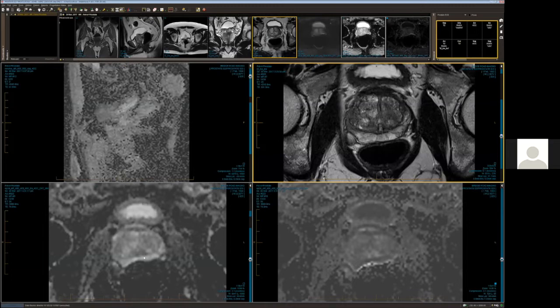Okay. And we know, don't we, that posterior TZ tumours are very rare. TZ tissue is young tissue. This chap isn't very old, there isn't much time for cancers to develop. When we do see tumours in the TZ, they tend to be anterior. So this is becoming a very unusual case. There aren't many Gleason 4+5s that are non-visible. This is very, very unusual.